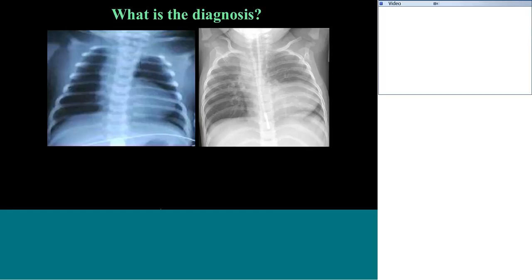Not only in the right X-ray, even on the left, it is a right-sided aortic arch. What percentage of them have the right-sided aortic arch, and in which is it common? Right-sided aortic arch is right, but what percentage?